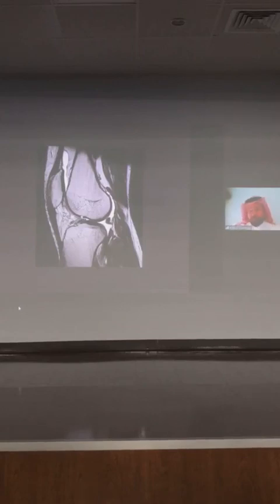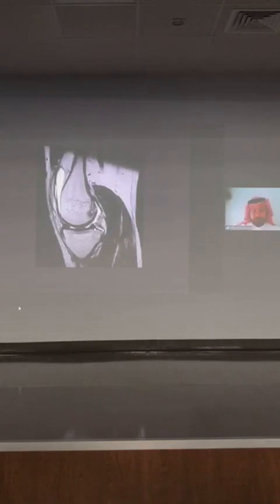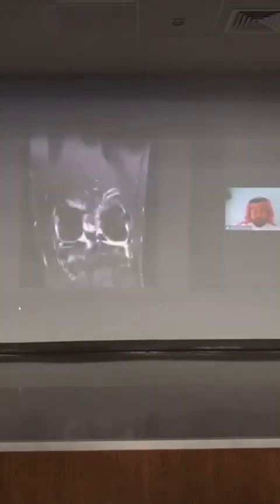So if I look at this image only, I would start thinking that this patient must have an ACL tear without even looking at the ACL itself. And if I go more medially into the joint and start looking for the ACL, oops, there's no ACL, the ACL is gone. This means that this patient has a full thickness tear of the anterior cruciate ligament in this case. And this is the posterior cruciate ligament over here. And there might also be some truncation of the posterior horn of the medial meniscus in this case as well. So this was the ACL injury.